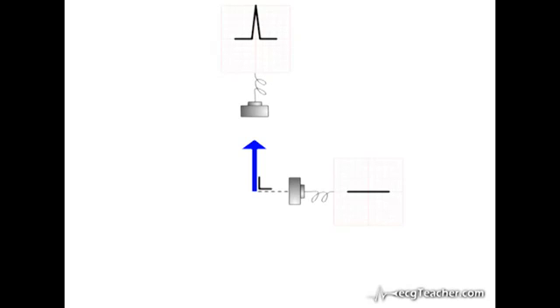However, for now, it is important to realize that if a depolarizing or repolarizing current is traveling at 90 degrees relative to a lead, it will not be recorded by that lead. As the ECG leads record electrical events from different perspectives, a lead observing this current from a different angle will record it. One important consequence of this is that an electrical event in the heart may be recorded by some leads but missed by others. For this and many other reasons, the duration of the major events of the cardiac cycle appears to vary between ECG leads.